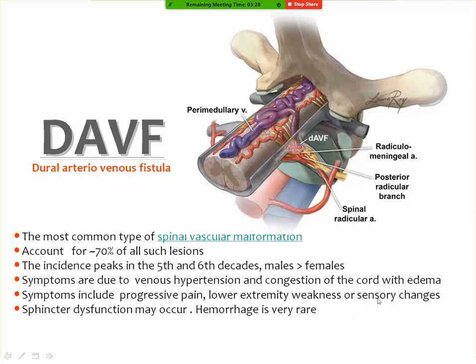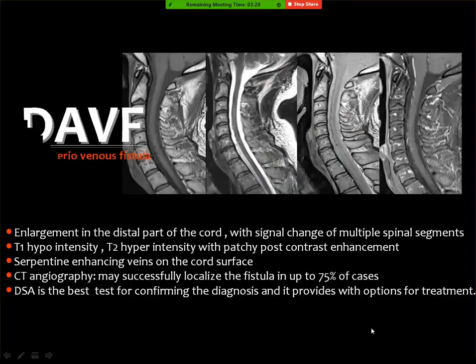And this dural arteriovenous fistula is commonly missed in the clinical practice because if you look here and you can see some vessels, you say these may be the normal epidural vessels or the artifacts or whatsoever.